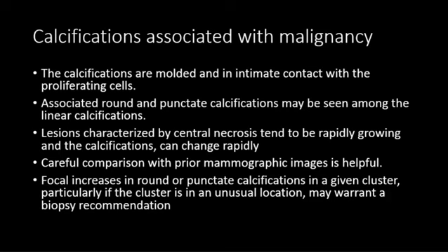This is a very suspicious behavior. If you see some calcification today, I'm not sure, maybe benign, maybe malignant, I can repeat the mammogram after a while, and when you repeat it, the calcification is completely different. It's changing in shape, in size, in number, in density. This is a suspicious thing when you see a calcification that is changing.